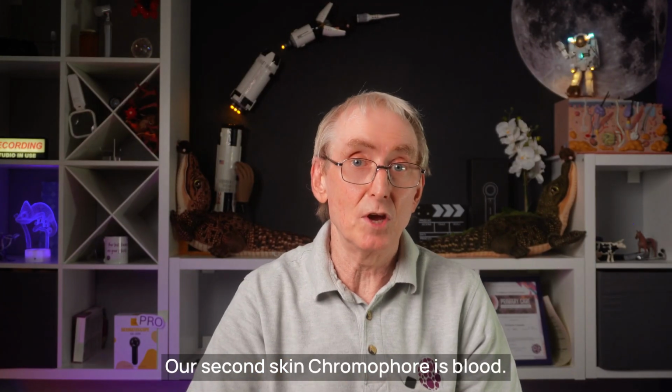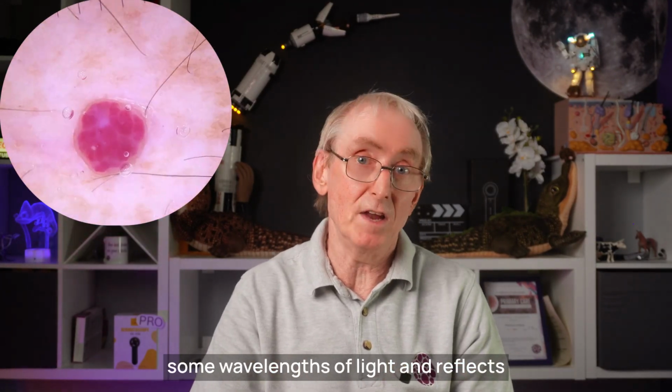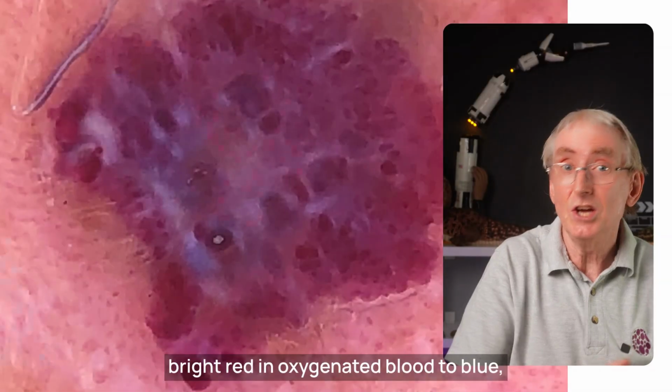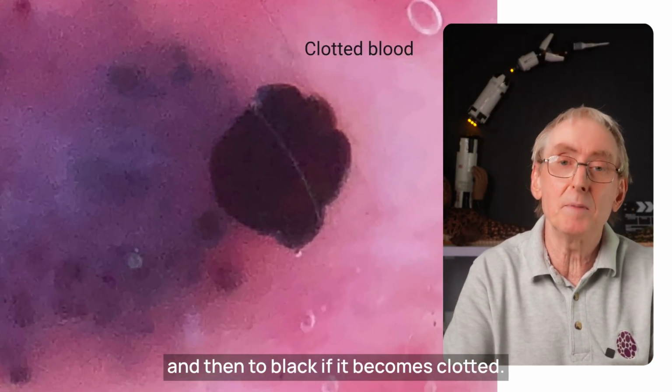Our second skin chromophore is blood. Hemoglobin in red blood cells absorbs some wavelengths of light and reflects others, giving us the red colour. The exact shade of red can vary from bright red in oxygenated blood, to blue when it's deoxygenated, through to a purple, and then to black if it becomes clotted.